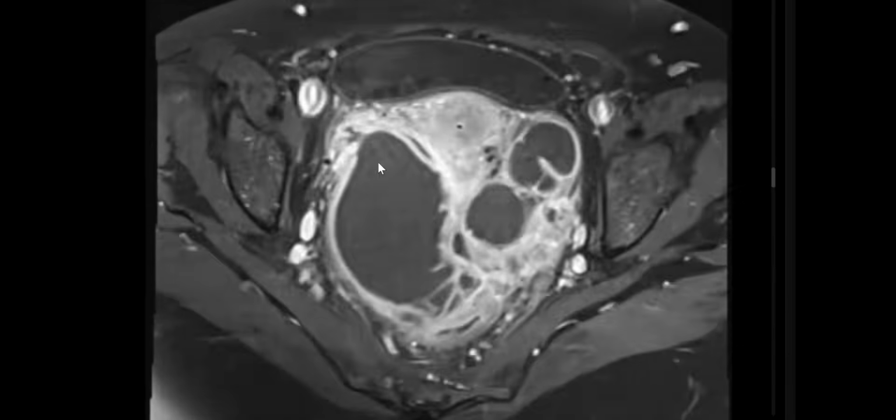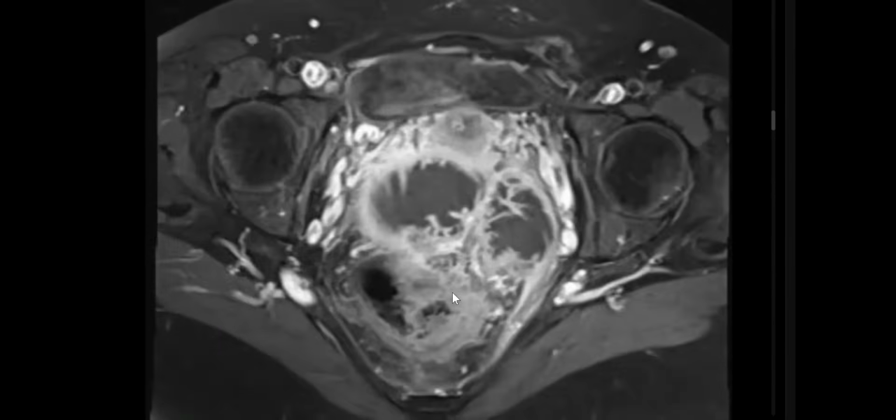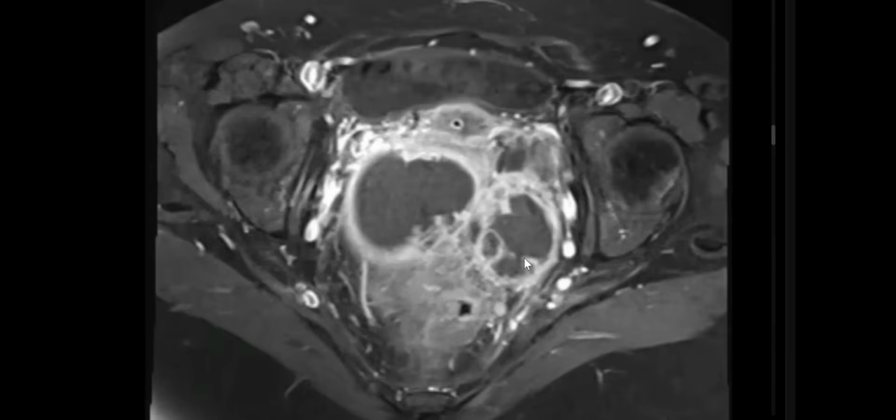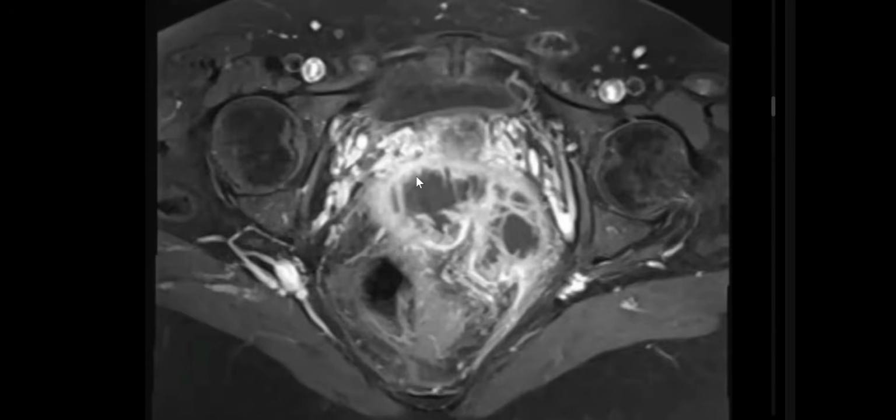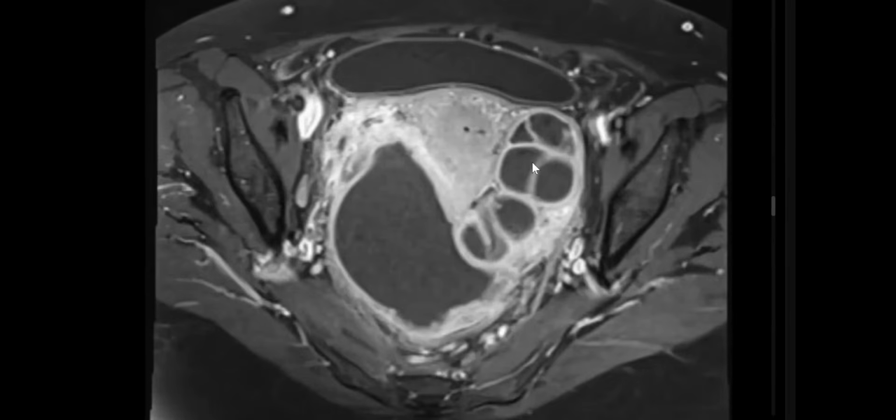Yes, you see the tubular structure, which goes with a dilated fallopian tube, and also incomplete septi, this rosette pattern or spoke wheel pattern. So it's a bilateral tubo-ovarian abscess.